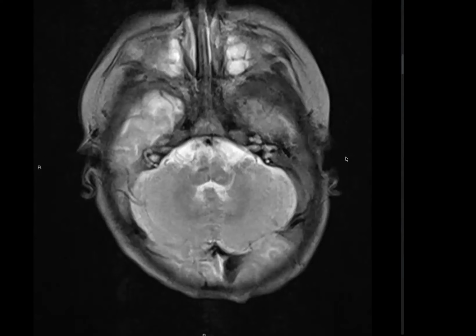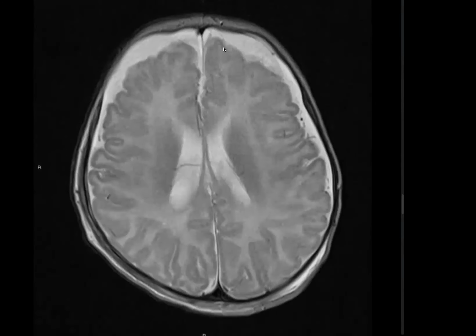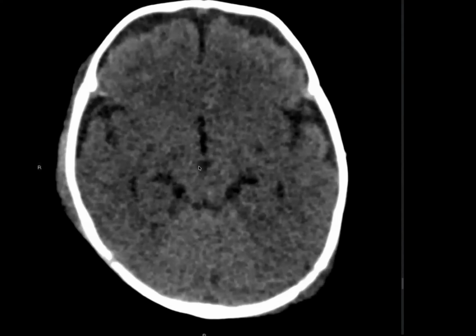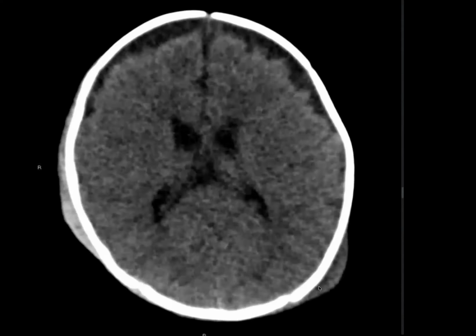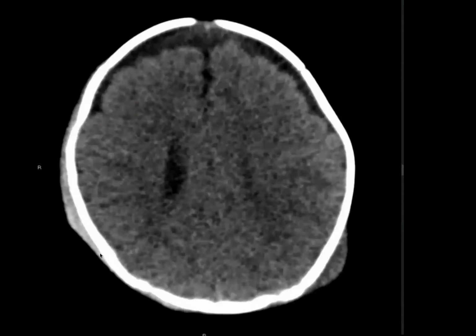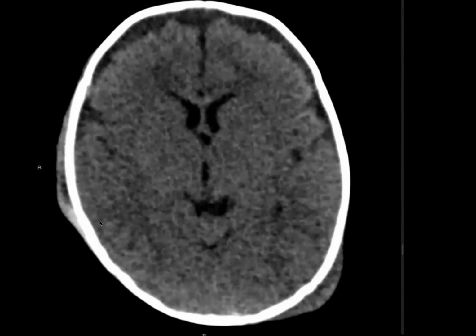Okay, we'll just have a quick discussion. So yeah, you're absolutely right. You just need some polishing up, but you've got the diagnosis right. I just wish you were a bit quicker in diagnosing the hemorrhage. You mentioned the fracture quite early. I know it's quite challenging. If you had the bone window, you would have definitely been more definitive about the fracture lines, but they often don't have the best sequences for you, but you're still expected to treat the case in a way you would, even if it's limited.